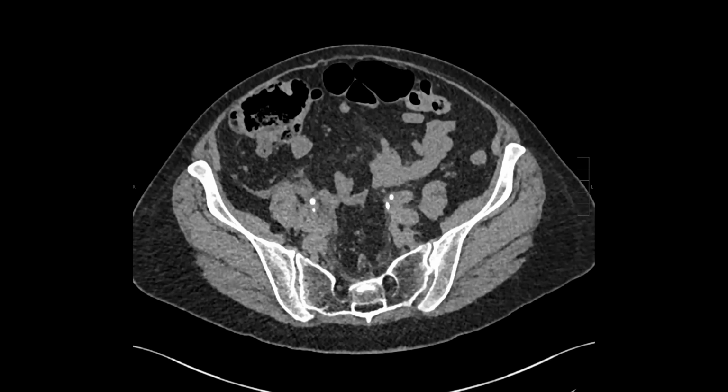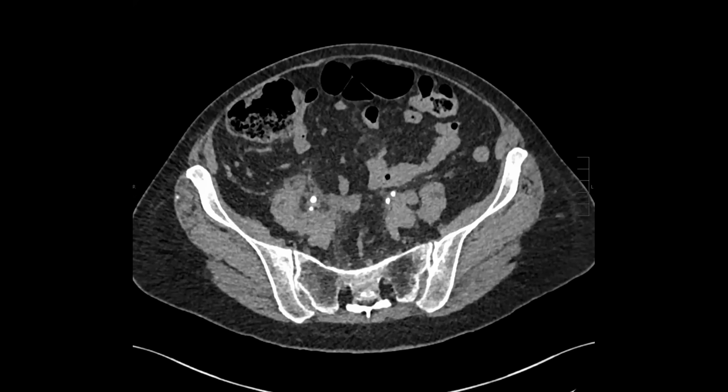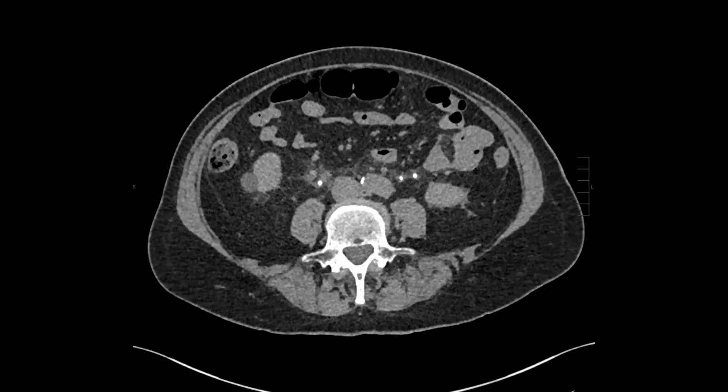Is it bilateral? No, I thought it was just unilateral, but let's double check. There's my 2 ureters there on Radiopedia, the left side. Oh man, I had a Radiopedia thing up. Shoot. I think Teresa's right. It looks like there's 2 ureters on the left as well. Oh yeah. But this one is a blind ending bifid ureter.